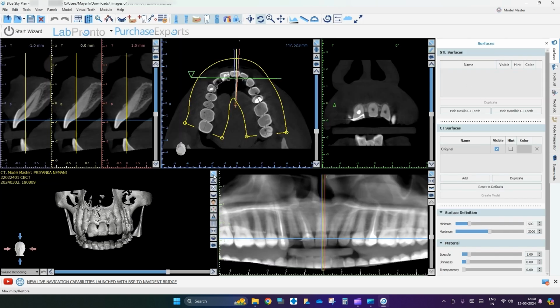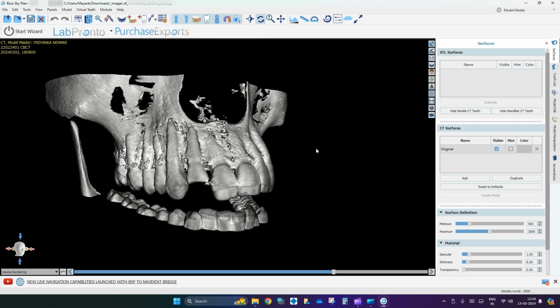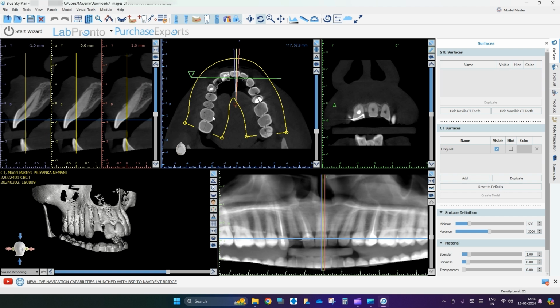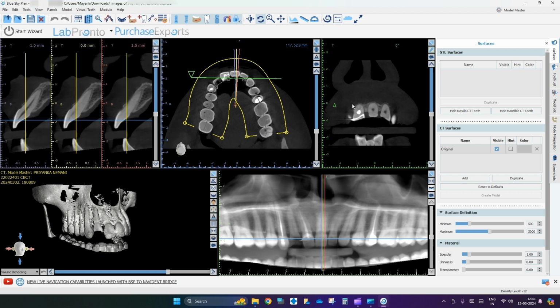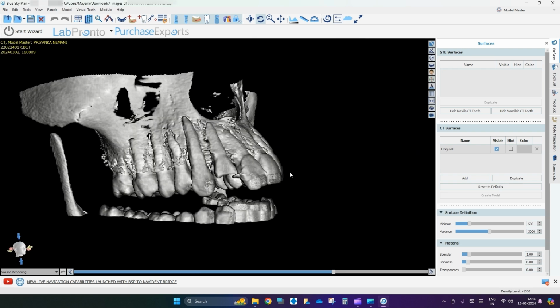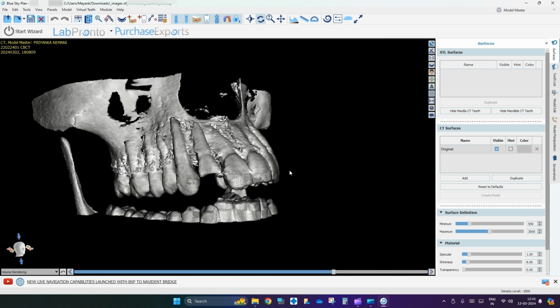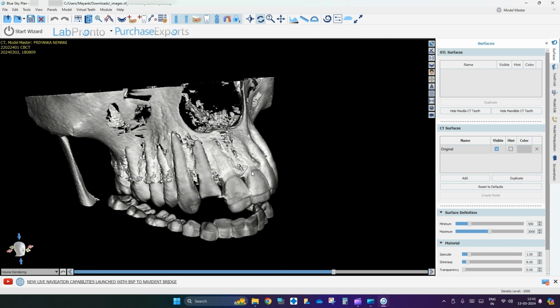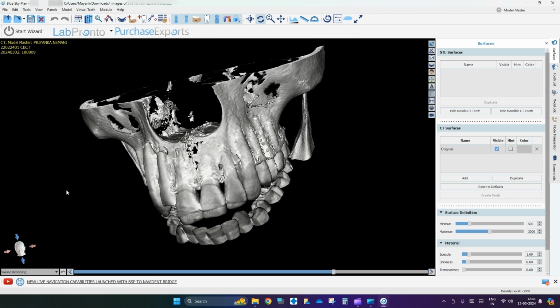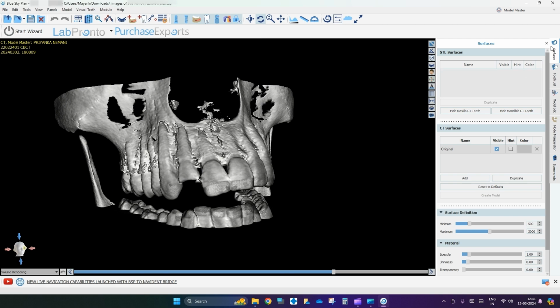If you don't find this screen when you open the software, it generally starts with this screen. So you can use the shortcut F3, which helps you come to an implant tangential 3 view, where you have 5 windows in all the cross sections. The case today is of a patient who's fractured her lateral incisor and the central. Luckily it was a whole segment, so we have bonded it directly to the tooth, and the lateral is completely out of the socket and is quite brutally fractured, so we've decided to consider it for an implant.